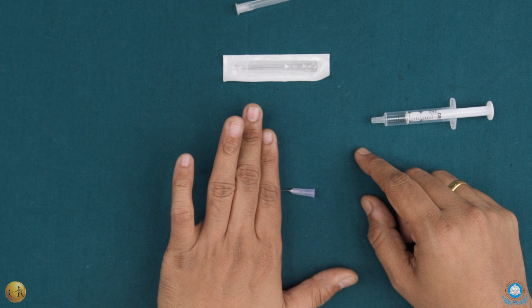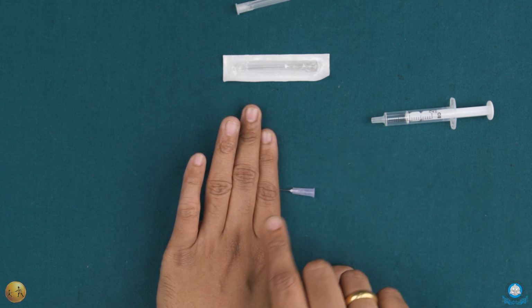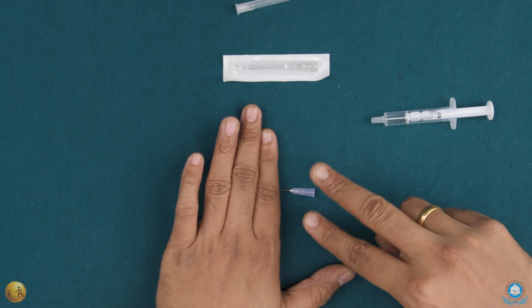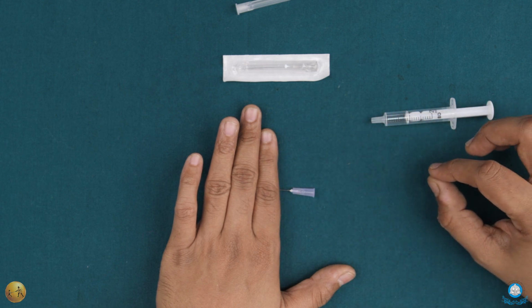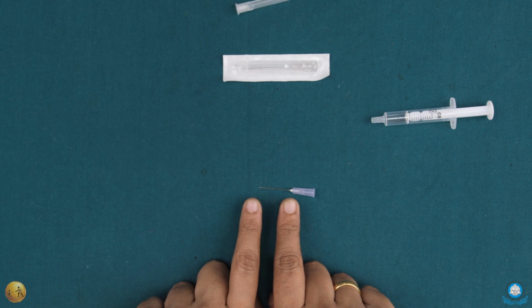But if you inject with a part of the needle outside and by some unforeseen circumstance you have a needle separation, you still have a part of the needle that can simply be grasped by either a hemostat or a curved artery forceps, and the needle can simply be pulled out. And that is the reason why the entire length of the needle should never be inserted into the patient's soft tissue when you are actually giving your local anesthesia.